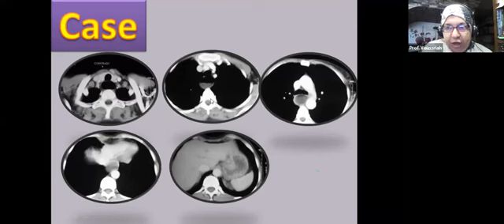This distal obstruction could be organic. Maybe downwards we will see an obstructing lesion, whether extrinsic or intrinsic, a mass, whatever. And then if you don't see a lesion causing this obstruction, then you are dealing with a functional obstruction. Okay, let's go down.